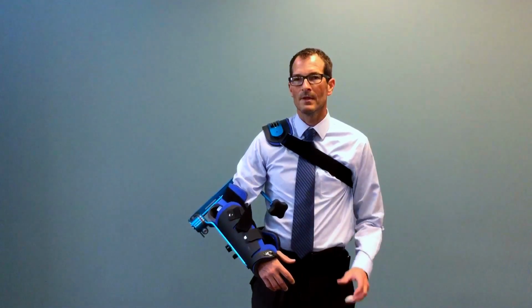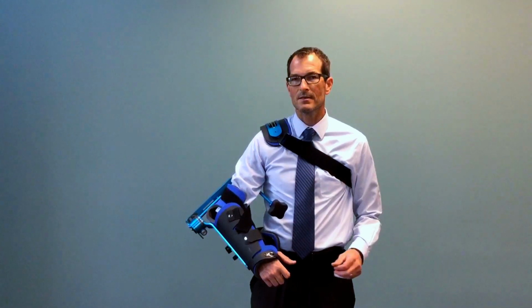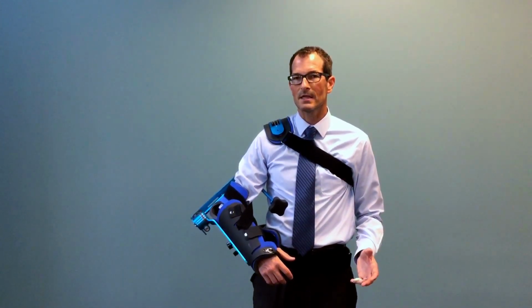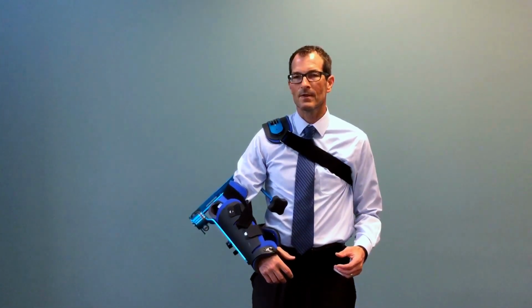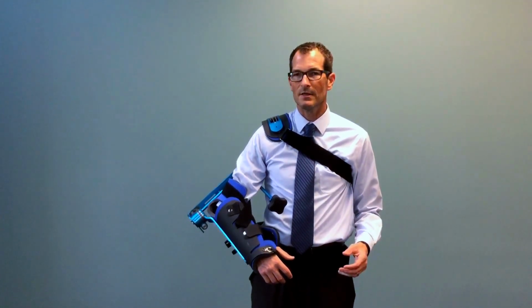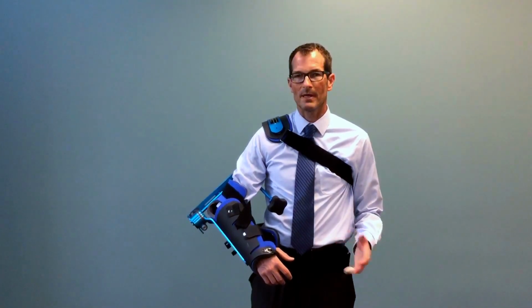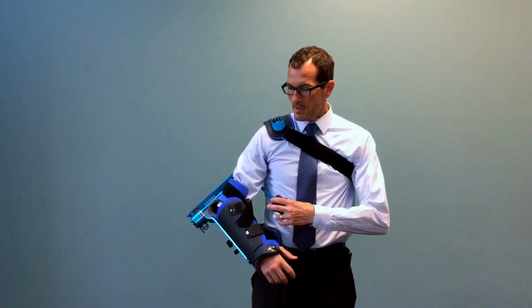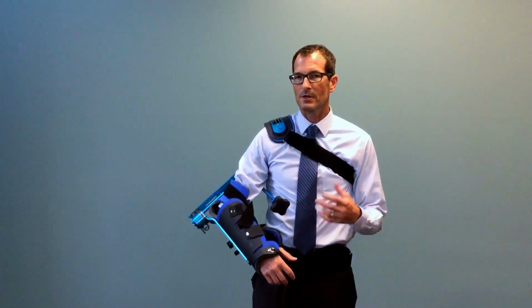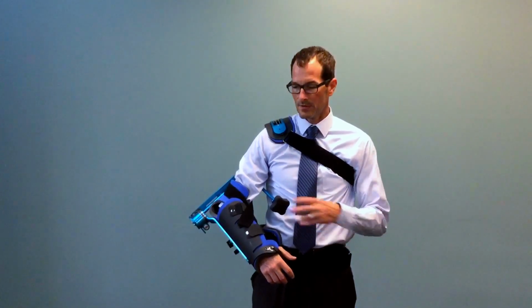That's the same perception we would want somebody to have in their shoulder. They're going to do this protocol 3 times for 30 minutes, but when we encourage the patient to use our device, we're going to encourage them to think of that as 6 5-minute treatment sessions, which will equal 30 minutes. You can certainly advance that treatment session if you want to in regard to longer wear times, if that's indicated for the patient's progress. Now what I'm going to do is show you the overall functionality of the device, and some of the advantages in regards to design when it comes to the Stat-A-Dyne shoulder.